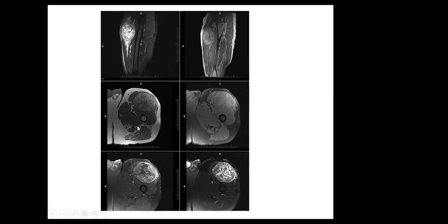Quadriceps, hamstring. This is actually gluteus maximus muscle here because it's higher. The tumor is high in the thigh, proximal. So you have adductor, hamstring, and quadriceps compartments. If you can localize it to one muscle, it would be even better. In the quadriceps, you have 4 muscles. I think this is most likely in the rectus femoris muscle, because we see vastus medialis, intermedius, and lateralis here.